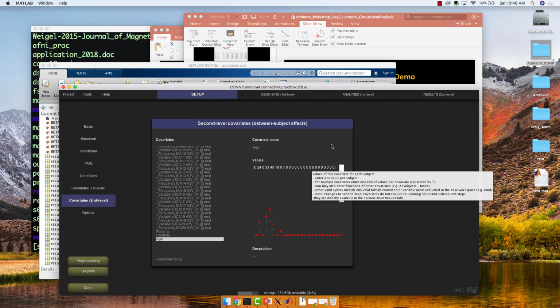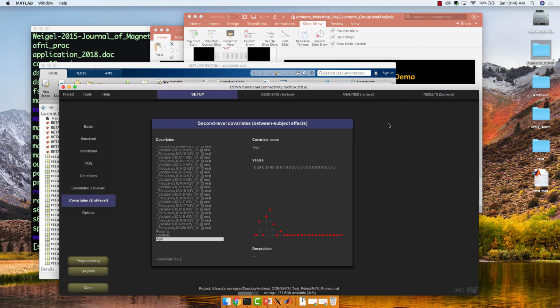I'm sorry, I just don't know if I'm misunderstanding, but what are those values constituting, like for the age contrast? That's their actual age. Yeah, you're inputting their actual age. Oh, okay. Ideally, you should probably mean center it to be safe, but yeah.